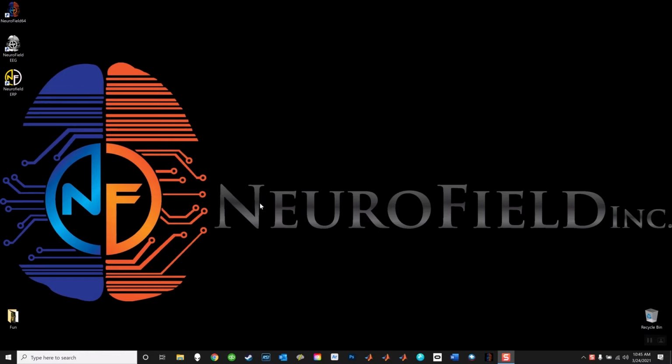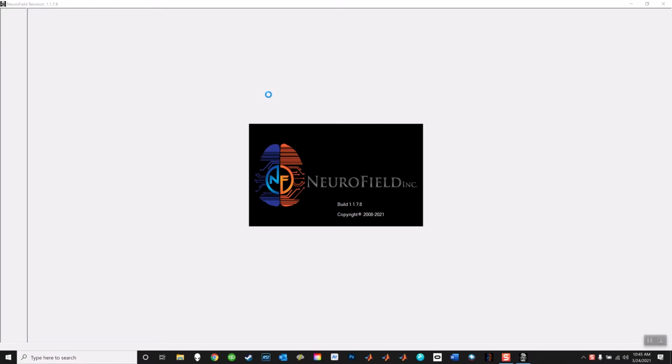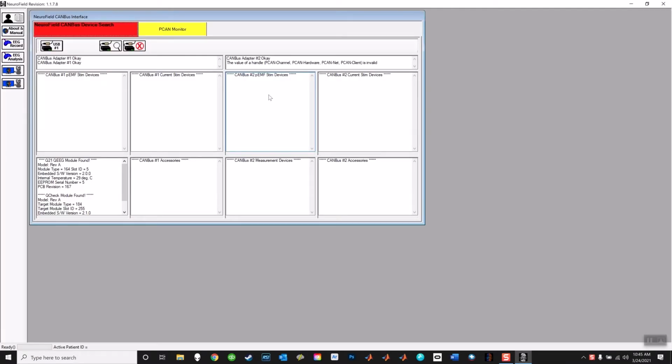As you can see, I have it installed on my computer here, so I'm going to just double-click and start the program. This tutorial reflects version 1.1.7.8 of the NeuroField EEG.